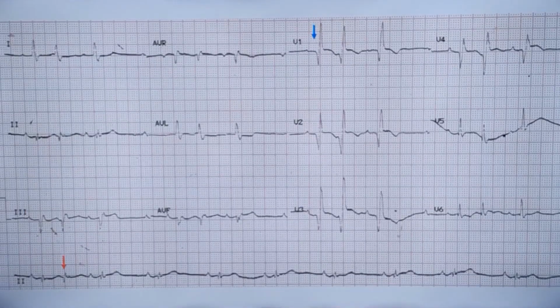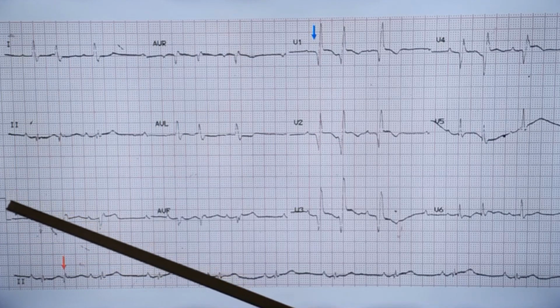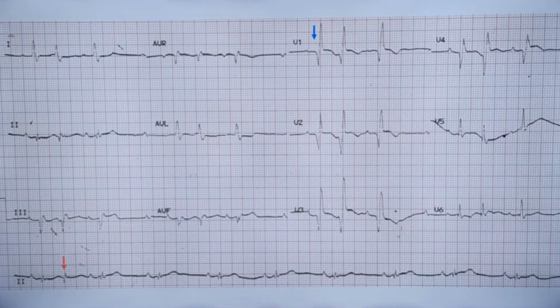Today we will discuss the sequential analysis of an ECG in the usual recommended pattern, starting from standardization, P wave, and so on. This ECG is taken in usual standardization, 25 millimeters per second of paper speed. You can see the standardization pulse here. It's a good rectangular pulse with perfect corners, indicating that the machine is well standardized for ECG recording.